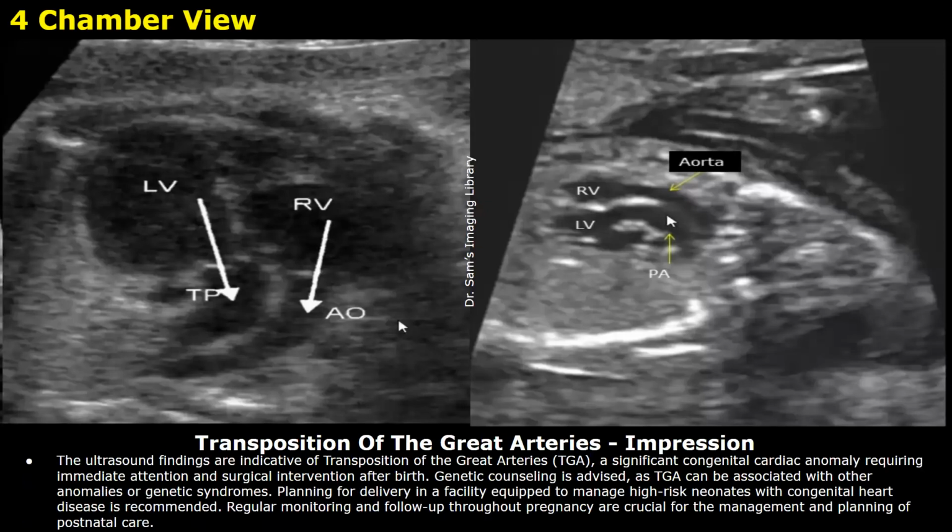This is the impression. The ultrasound findings are indicative of transposition of the great arteries, a significant congenital cardiac anomaly requiring immediate attention and surgical intervention after birth.